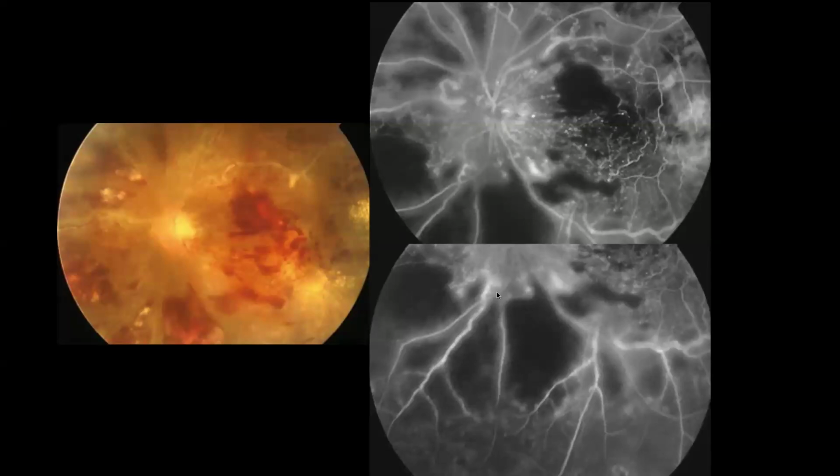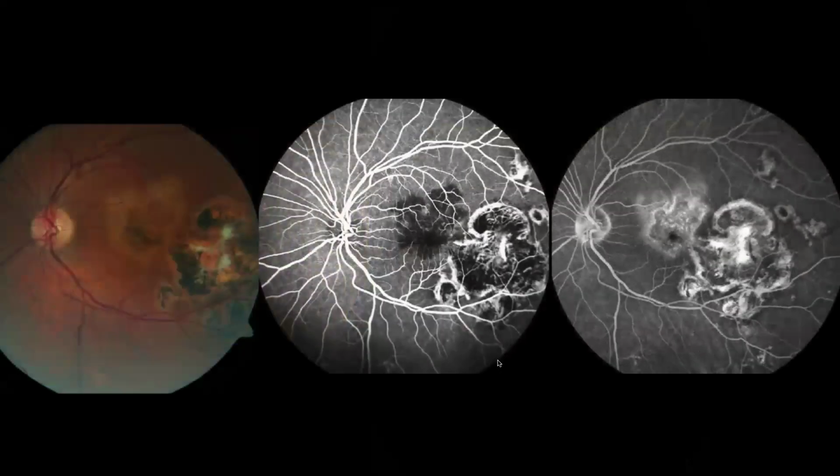Okay, what about this one? There's also, it looks like vasculitis. Hindi, itong ano, parang area na to that I'm outlining. Capillary dropout. Okay. So it's parang retinal non-perfusion, capillary dropout associated with retinal vasculitis. So it's occlusive retinal vasculitis. Okay? Sige.